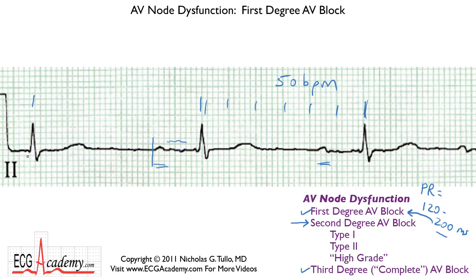So when you're trying to decide exactly where the QRS starts, if you only have one lead to look at, look at multiple QRS complexes. And I dare say that the QRS really does start with the first upward deflection, that this first bump doesn't count. So if we say the QRS starts with the upward deflection, that would be about here.